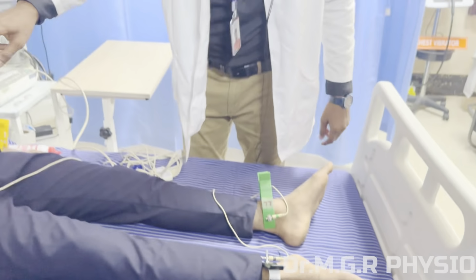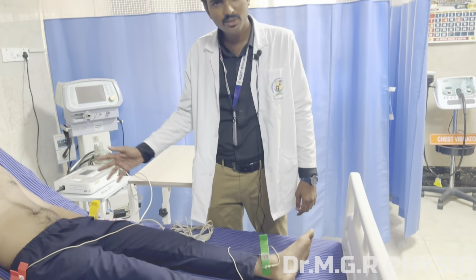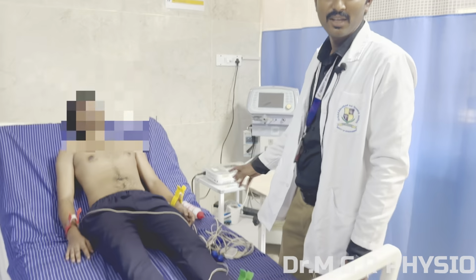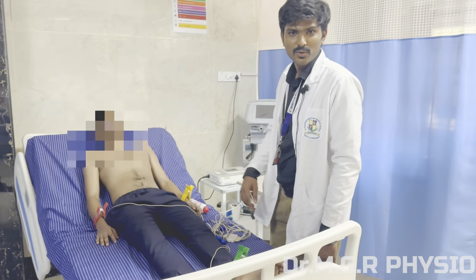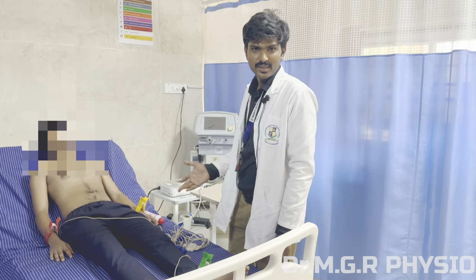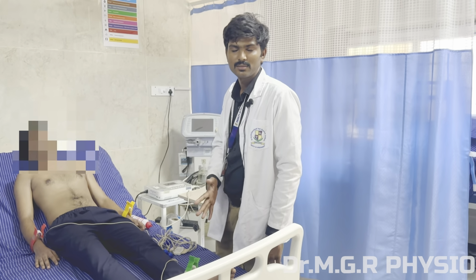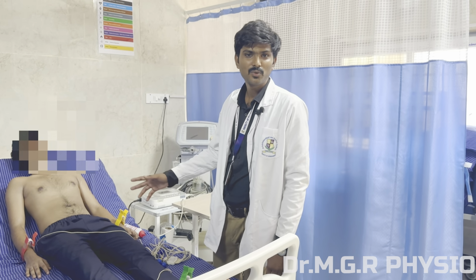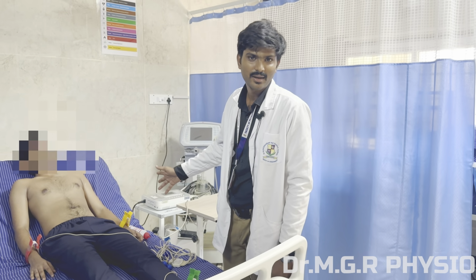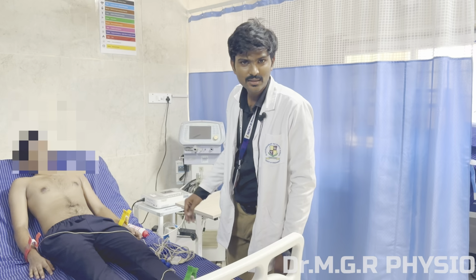These four electrodes basically form something called Einthoven's triangle. The limb leads are also called Einthoven's leads because they were discovered by someone called Willem Einthoven. So that completes the Einthoven's triangle. This shows Einthoven's law, which is basically that the summation of potential difference across any two leads is equivalent to the third lead. That is, lead 1 plus lead 3's amplitude is basically equivalent to lead 2's amplitude.